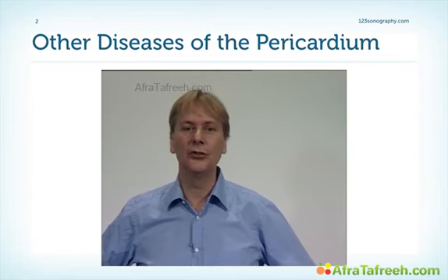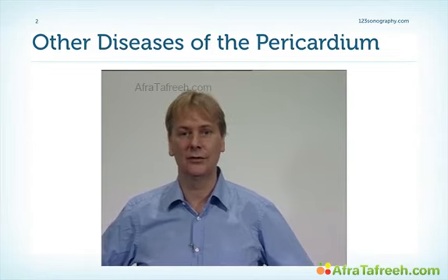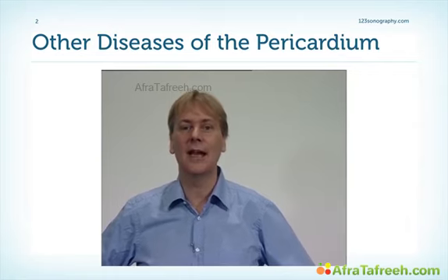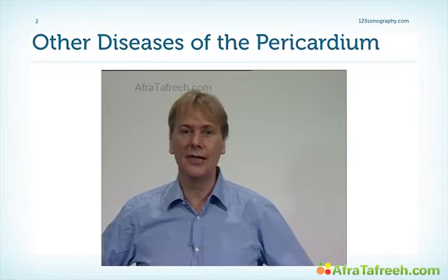Certainly, pericardial effusion is the most frequent disorder of the pericardium that you will encounter. And of course, pericardial constriction is very important as well because it has a lot of consequences for the patient. But there are also other diagnoses that you can make which relate to the pericardium.